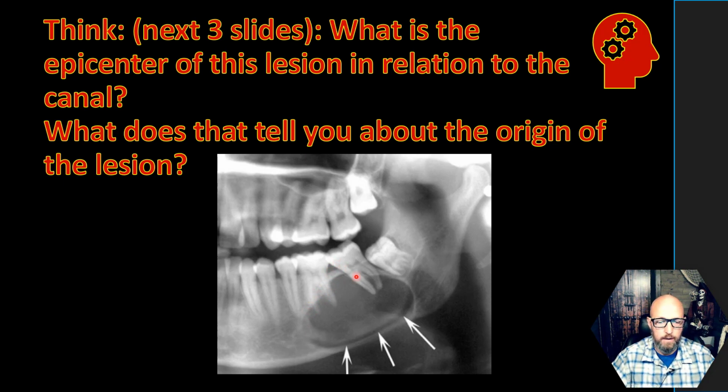And this one, could it be a periapical cyst? I don't see anything going on with these teeth telling me that there's high likelihood of a periapical inflammatory lesion, but I couldn't rule that out. This turned out to be a cystic ameloblastoma. We'd have probably OKC on the differential. Those are fairly common as well. And then you might start listing your less common things.